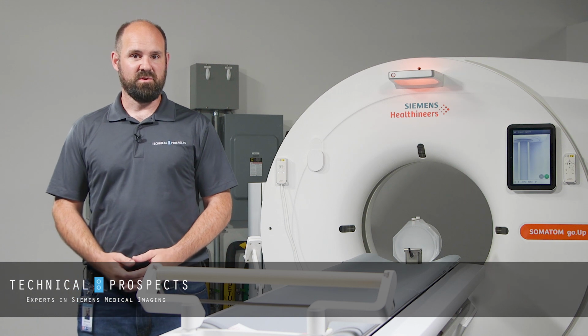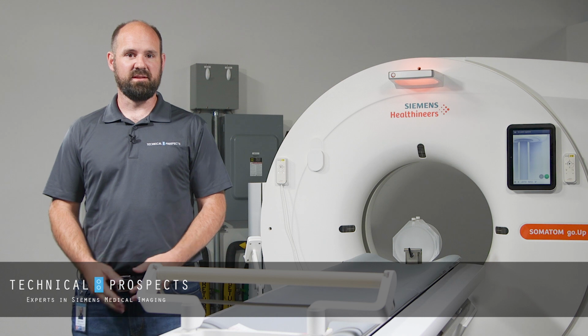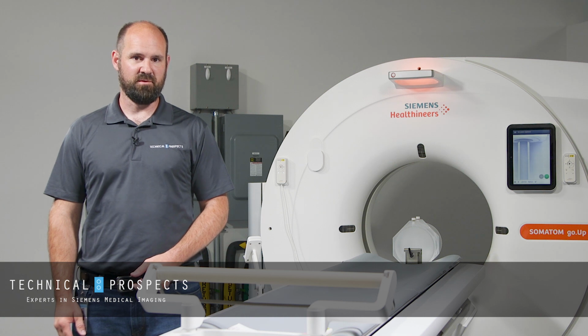Whether you're a seasoned expert or just getting started in medical imaging service, this series on the Somatom Go and Syngo Native is designed to elevate your comfort and knowledge of the platform.